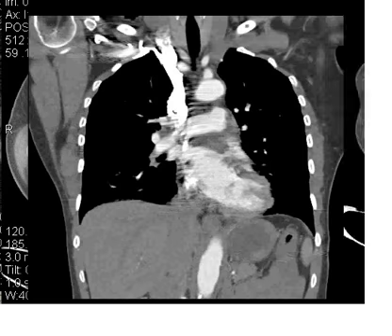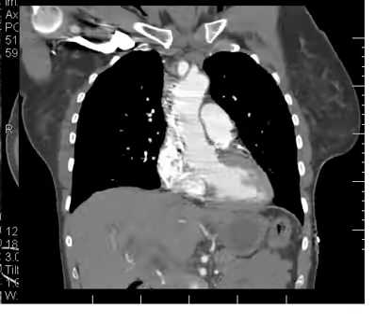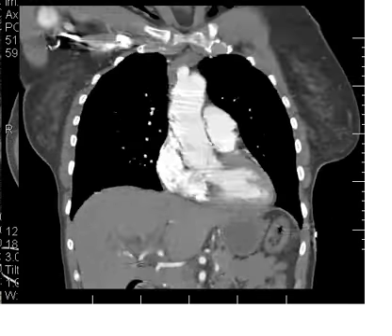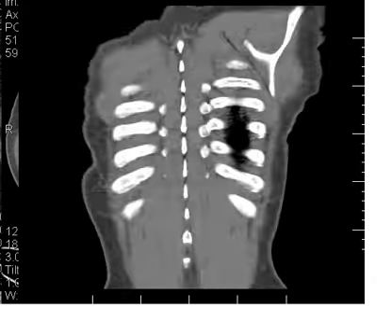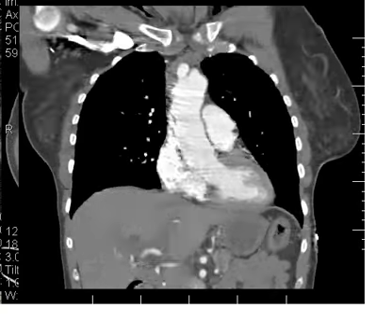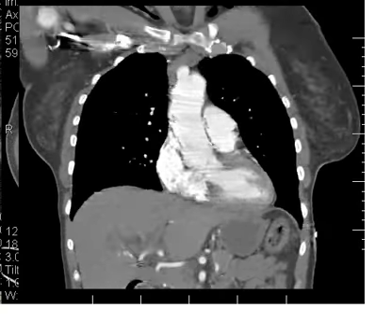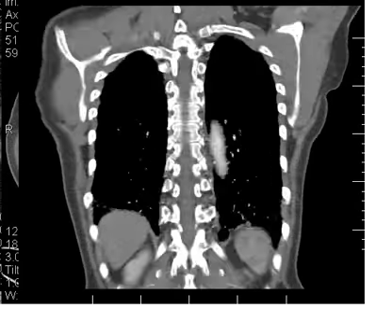Now I just want to go to a coronal. And here, this is the same patient, just to give you your orientation, because these are often very helpful, and they can actually be quicker, because going through a coronal like this, zip, is often the quickest way to get a quick view and see if there's obvious PE. So if you want to get a look yourself, you just kind of go through like this. All right, now let's start from the back and go forward.